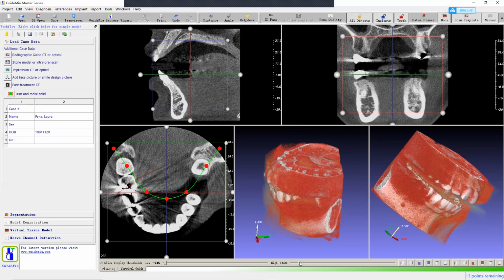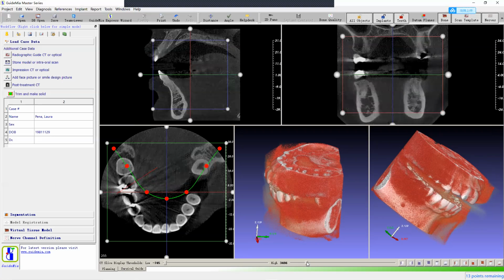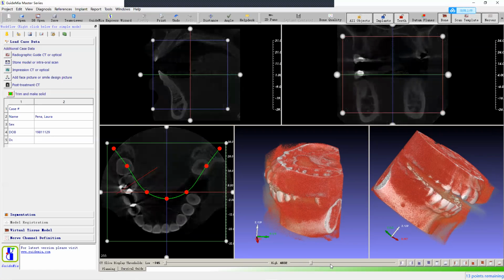If we go higher, meaning we want to show all the pixels from the entire range, then everything shows up here. But in the meantime, you see the contrast is getting lower. It's not so bright because we are trying to show the entire range from minus to about 10,000.